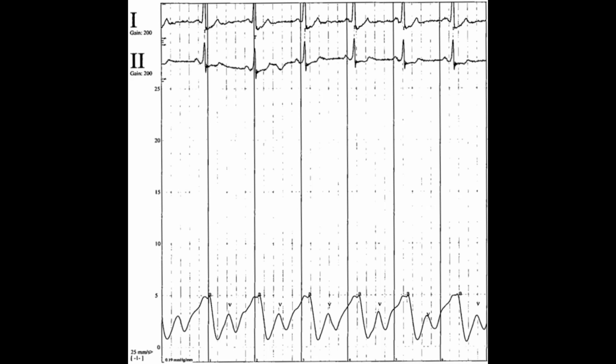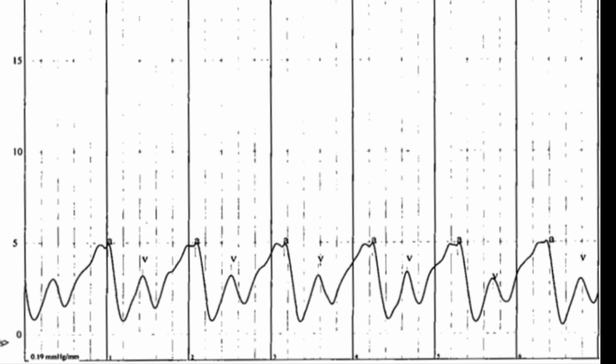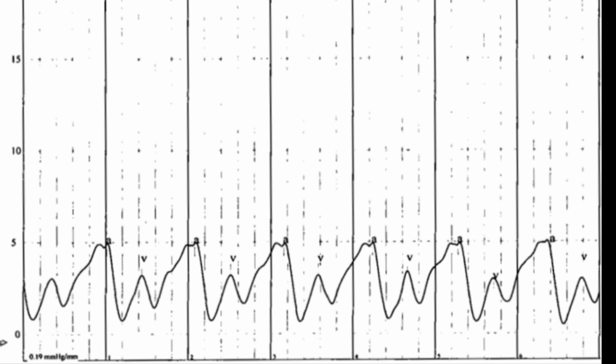Qualitative assessment of the right atrial tracing has several components. First is to comment on the waveform dominance, which is the waveform with the highest pressure value. A right atrial tracing in normal physiology is A wave dominant.